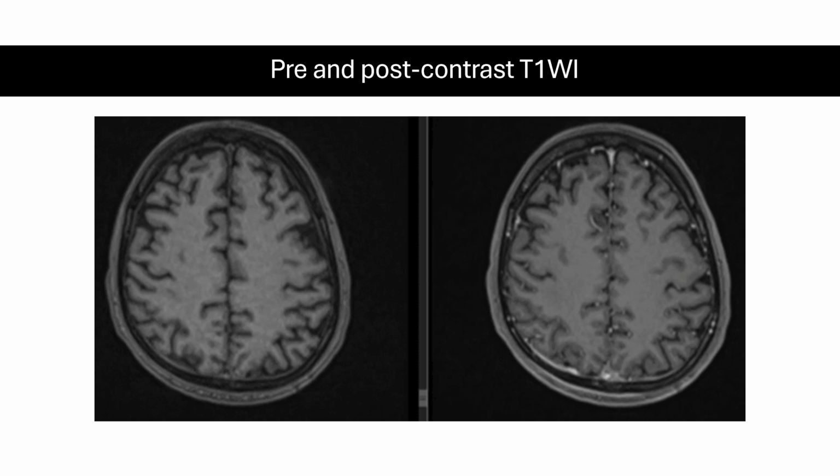So for further workup, whole body CT or PET CT is advised for the staging of the patient. And in this case, although there was no involvement in the thoracic region and in the abdomen, usually meningeal involvement is a sign of disseminated disease.